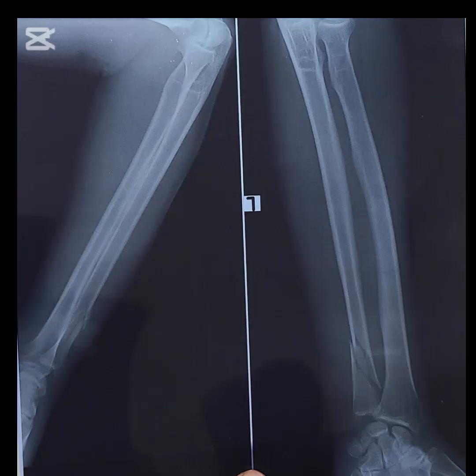So the X-ray revealed a spiral fracture in the distal ulna, as you can see from this picture of the X-ray. On your left is the lateral view, and on your right is the AP view. So you can appreciate in the AP view on your right the two bones, whereby the ulna is the smaller one distally and the radius is the bigger one distally. So that's how you can identify that this is the ulna, this is the radius. So it's our ulna that is having a spiral pattern of a fracture.